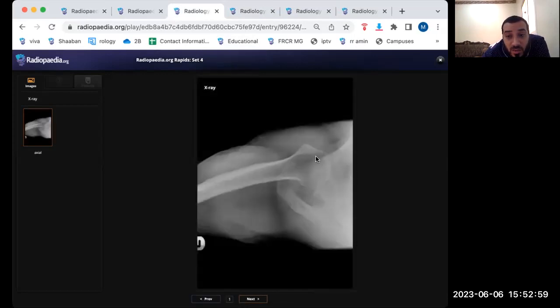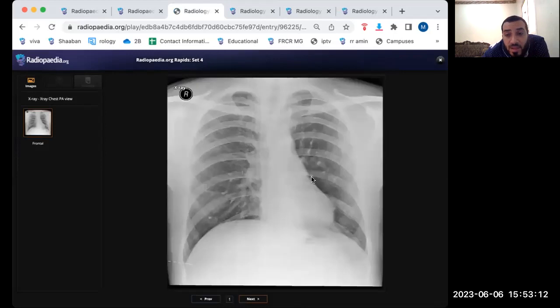This is the shoulder, the glenohumeral, the glenoid and the humeral, the coracoid, the acromion, and the clavicle is aligned with the acromion. So everything here is normal. Should trace every cortex, draw every cortex.